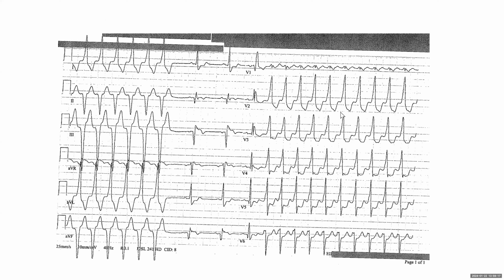So you have ventricular tachycardia, AV dissociation without AV block, right bundle branch block complete, sinus rhythm, left axis deviation, inferior MI, all of these. There was a comment about prolonged QT. Again, I would be careful with that. The QRS is wide, so it's probably actually not prolonged. It might be okay for the exam, but if you have a more obvious code, I'd go with that.